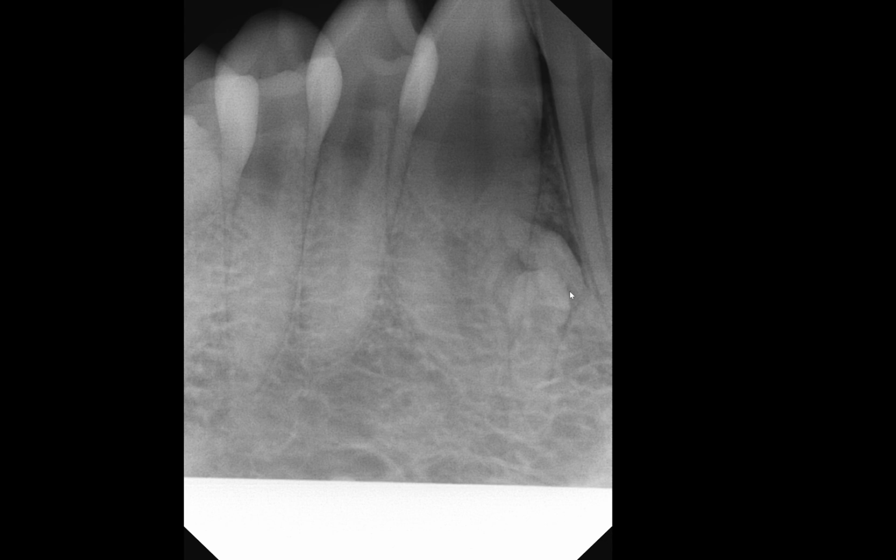And let's see, what else could I go over? They develop typically around the second decade, and I expect this is fully mature, meaning I don't expect this to continue to grow. Typically when the patient reaches the skeletal maturity and all teeth have been fully erupted, then that's about the same time this will also fully mature as well.